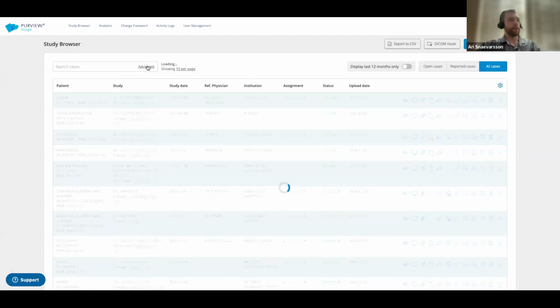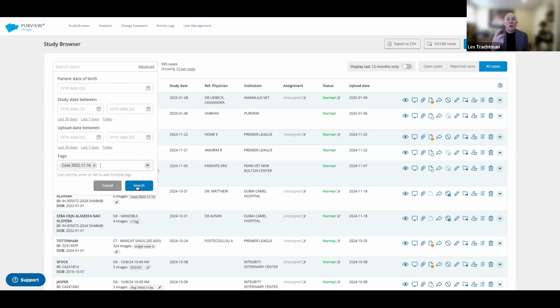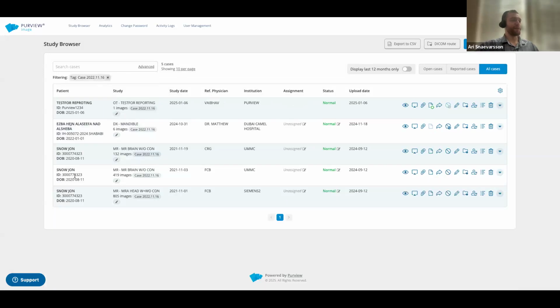In fact, I'd want to go on the advanced search here, and then I can actually pull up. You can do it either way. I've messed up before, and if you did it on the regular search, it'll work fine too. That's true. This will give you this case orientation where you can see all the studies associated with the case. But we decided to take that a step further, listening to our customers. Well, yeah, we decided because we were told, hey, that's good, but, as often happens, let me set the stage for that, Ari. Then you can show a little bit more about it.